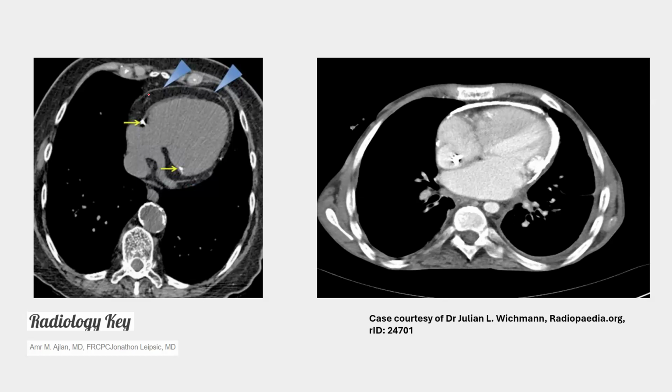So we measure the thickness of the pericardium here. And this is pericardial calcification, which is eggshell calcification. And you see how much it's going inside the muscle here at the vicinity of the AV junction. This is an important piece of information for the surgeon, because when he comes in here, he's going to have trouble. So he has to know what to do here.